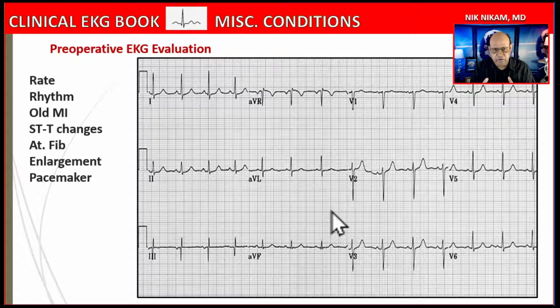But if there are multiple findings, you have to put all those findings together and see what is the risk of this patient going under general anesthesia. That's a pretty big question. So let us not take this for granted. Oh, I'm just reading a pre-op EKG, finished, go.